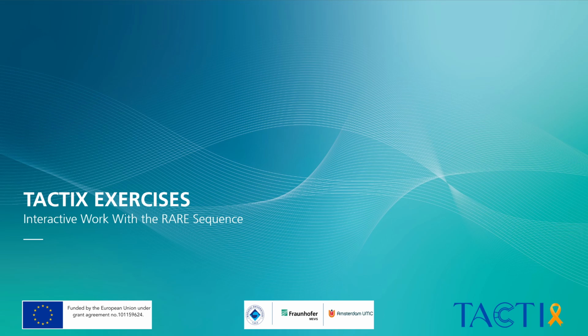Welcome to our TACTIX exercises. In this exercise we will work with the RARE sequence.